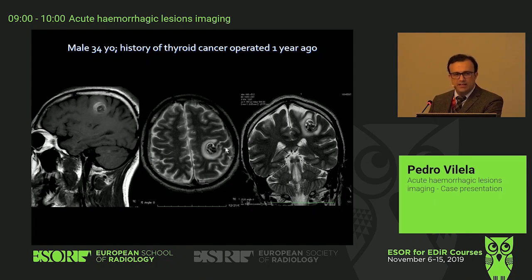Does this look like a lobar hematoma? No. Okay, so we have an underlying hemorrhagic lesion here. Want to see anything else? Contrast, not really, we could not depict contrast enhancement. It's very difficult in the phase that you have a hyperintense T1 lesion.